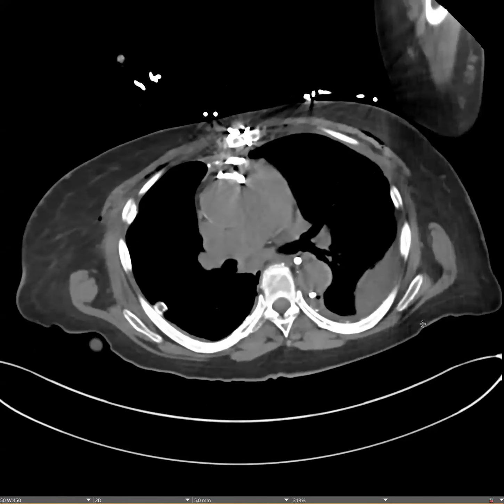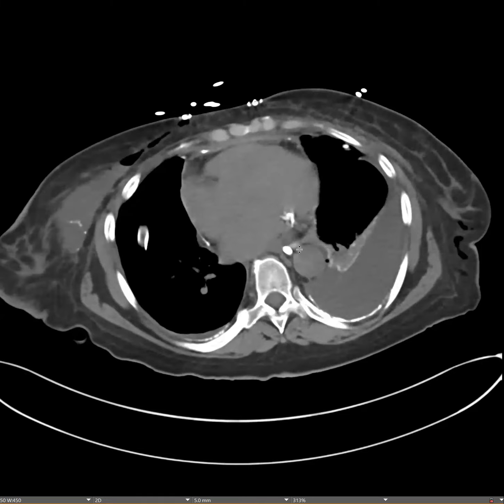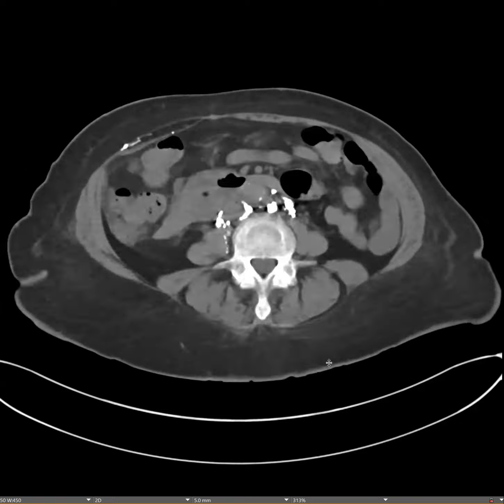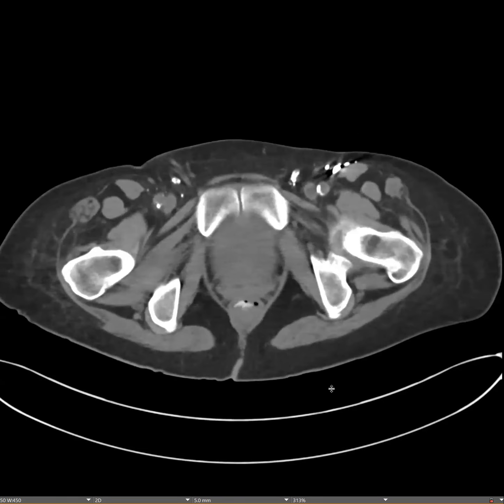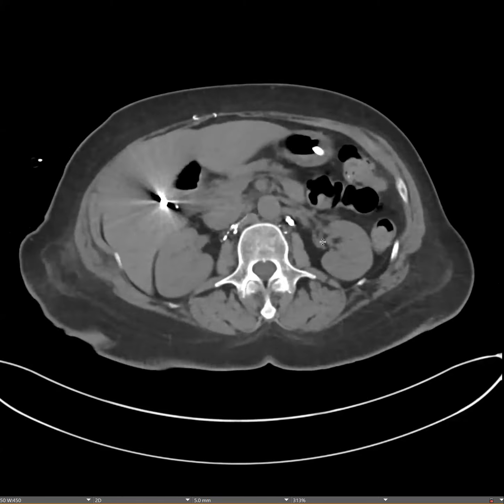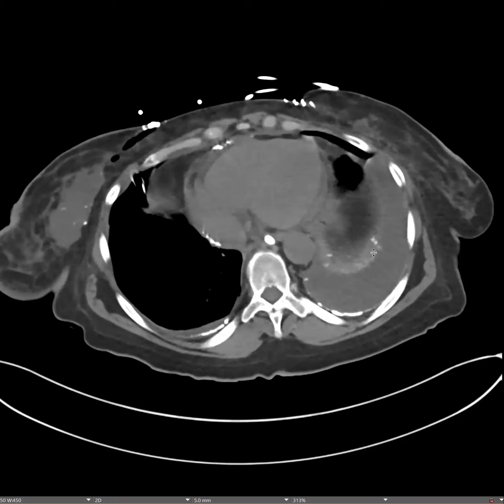That made us go back and look at the procedure, because the clinician only gave a history of thoracentesis. We went back and looked at the other procedures, and none of these were there. So these are just lipiodol from the lymphangiogram procedure they had the day before. All this is just contrast, not calcified lymph nodes. I wanted to show it for the residents to have this in the differential in mind.